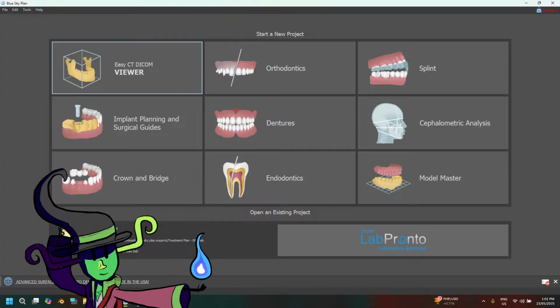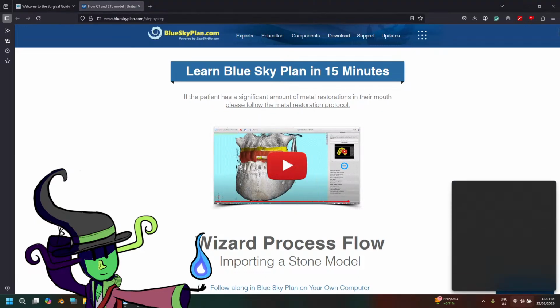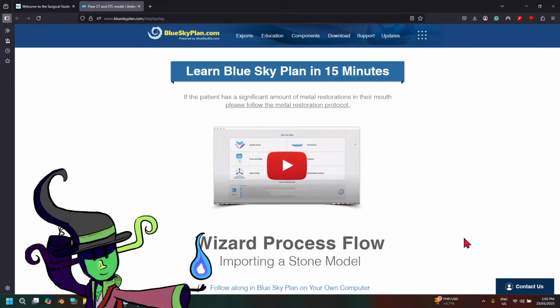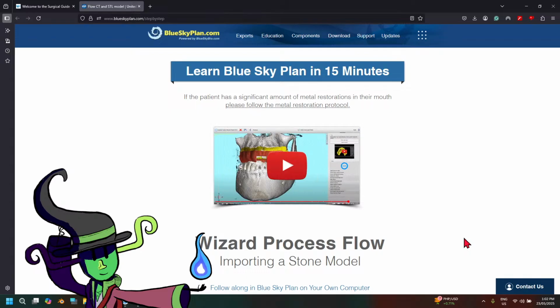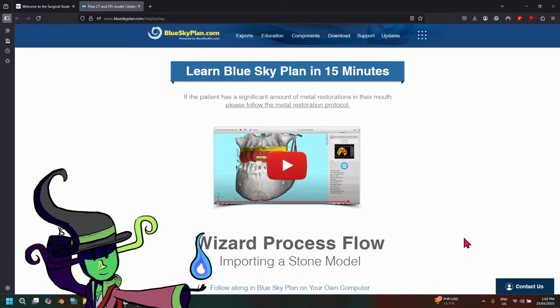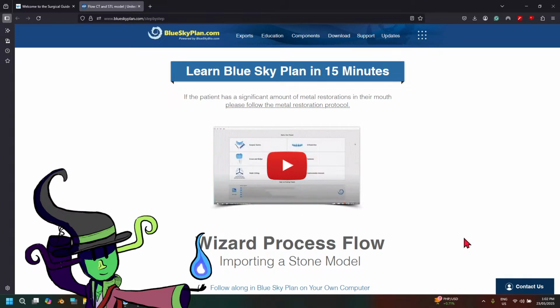I'll explain to you guys later why this is technically a free software, but this is straight up something that you can download for free onto your device. I am using a Windows computer right now, and I want this to be, I guess, the first software I study for this series. And this series I would maybe call Dental CAD or something, as a series of live streams. And I just wanna see if I can learn some of these and get used to these softwares, because I will be using this later on when I'm finally getting a job or something.